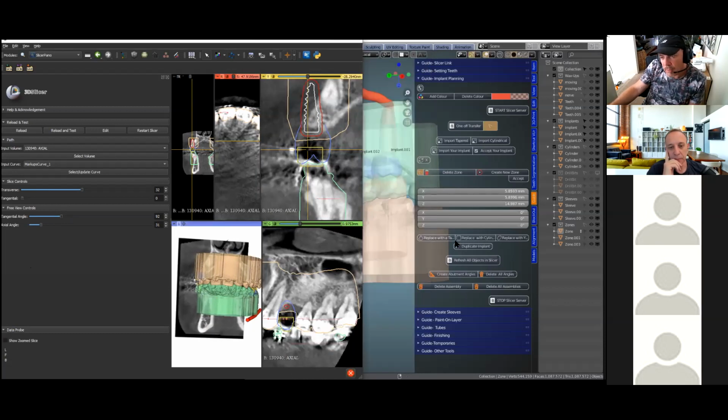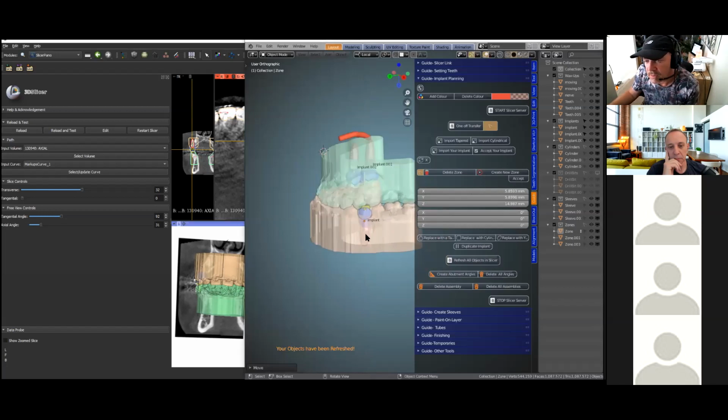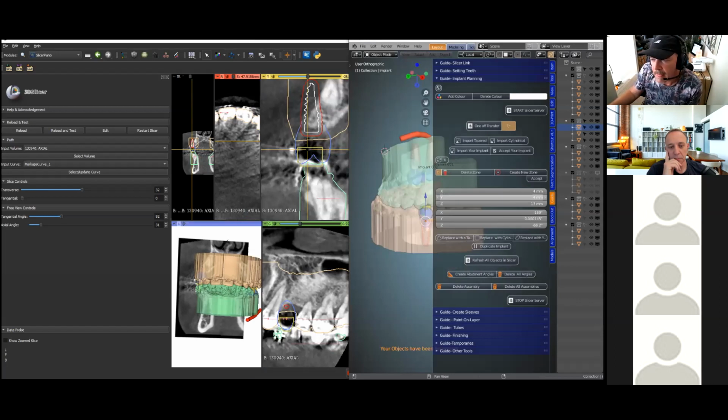And I know from experience that that is the x-axis. So when I've got this one selected and I move the x-axis, then it should move accordingly, and you can see how it moves. Okay. Is it best to always use the sliders, Michael? Yeah, it's always easiest to use those sliders to angle it.